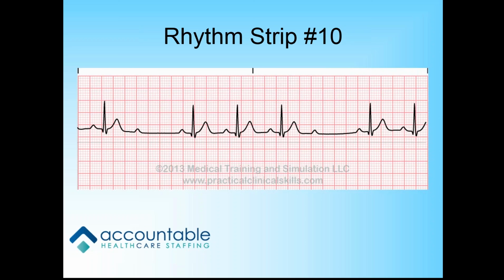Now this is what a normal second degree heart block looks like, guys. I just like the first one because that was my patient, and it's an unusual second degree heart block. This is what most of your second degree heart blocks are going to look like. Okay? Good job, Crystal. Thank you.